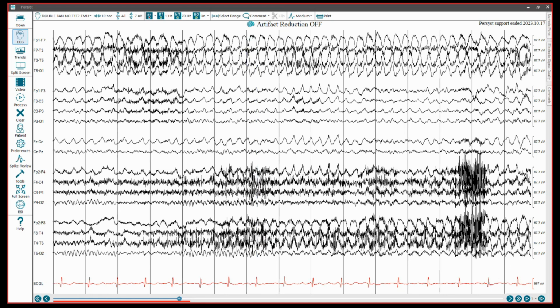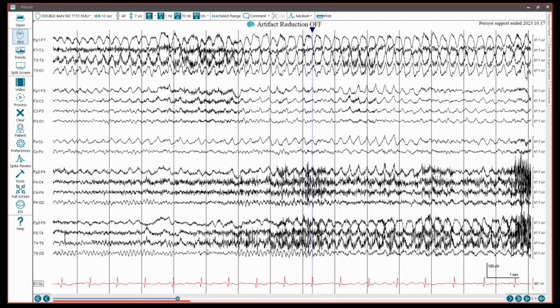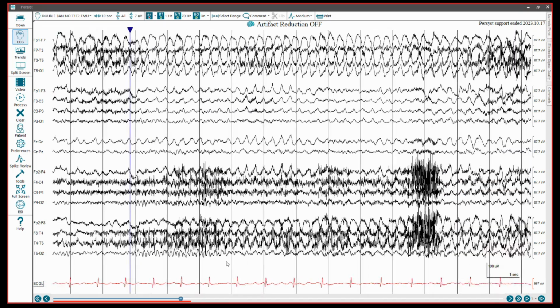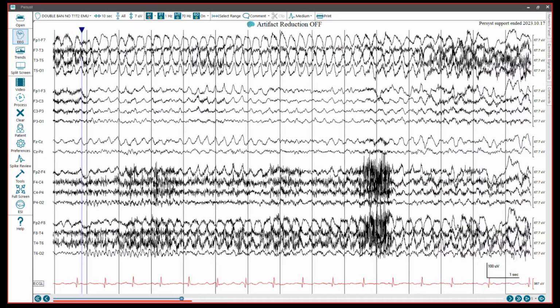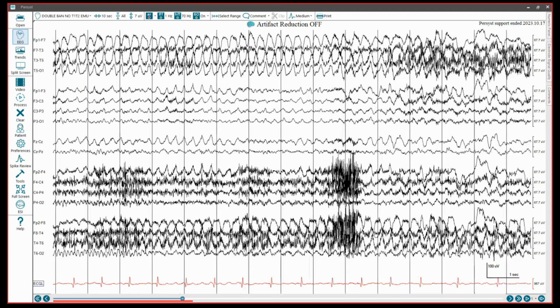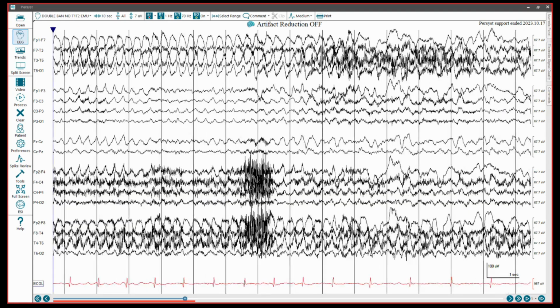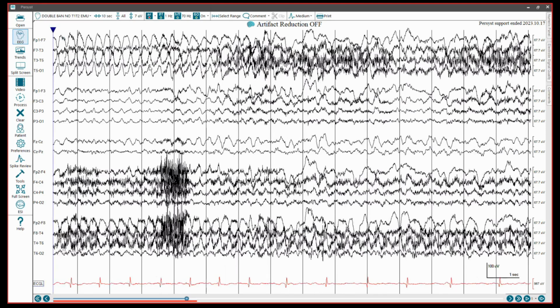And so watch what happens to the PDR over the right side. Now that PDR is going to be disrupted, more proof beyond the obvious that the activity is rhythmic and epileptiform. You can also see the PDR drop out. So now we have bitemporal participation. Since the voltage is so relatively high, it's certainly okay to trim your sensitivity. I'm going to back up a page. You want to be able to make out the individual waveforms.